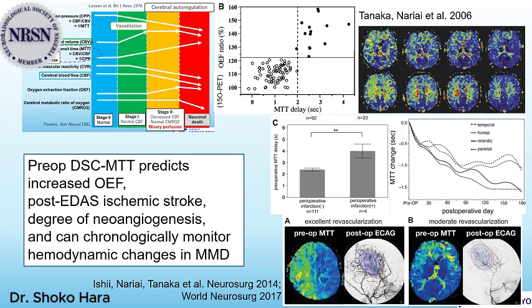These findings suggest that although CT perfusion and DSC cannot directly measure CBF and OEF, they can still provide surrogate imaging markers with meaningful clinical significance.